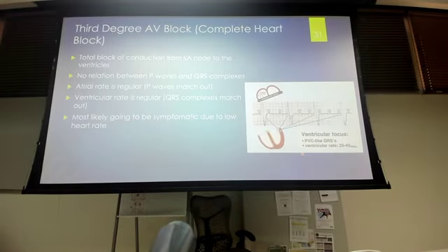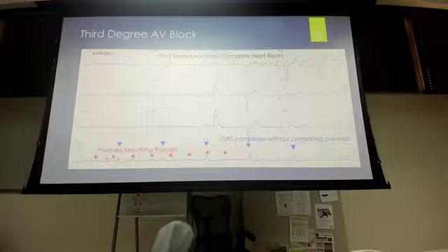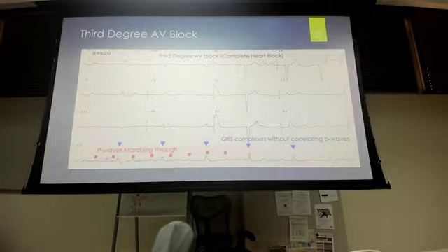In third degree AV block, your PR interval is not even really there. If you want to measure a PR interval, you can see, oh, looks like that's a first degree, it's way over here, right? I never really understand why people get them confused, but they often do. But in type 2, your PR interval is the same, and you just get dropped P waves. In Wenckebach, yes, it is prolonging, but you still see a very clear PR interval. It looks fairly normal, but it just gets longer.